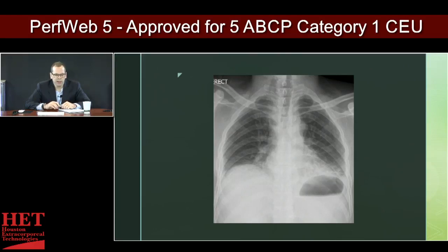The next thing that I look at is all the soft tissue structures. Obviously the heart, the trachea, the bronchi, the diaphragm, the stomach, soft tissues in the neck. Even out to the side, you can see subcutaneous air or emphysema out towards the scapulas.